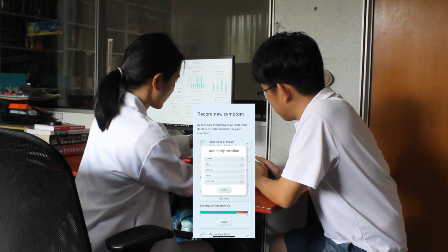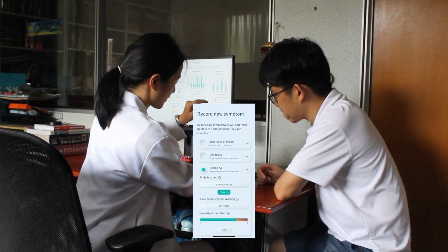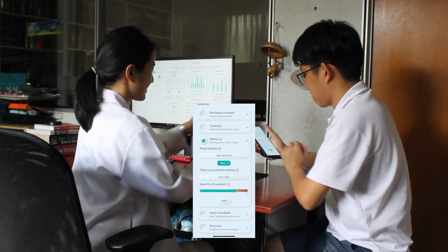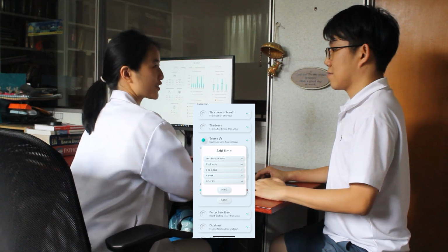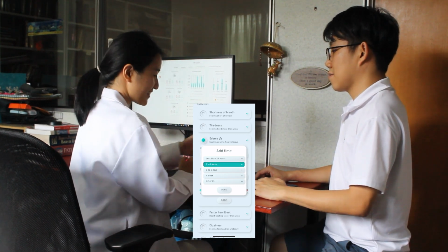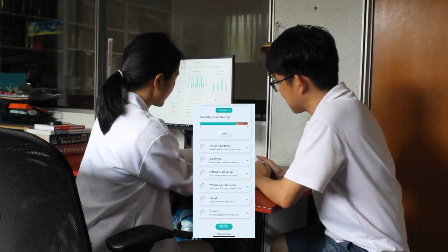After the patient has verified it, the intelligent agent will automatically prompt the patient to log in their vital signs. If a patient is out and does not have their medical devices to measure, it will remind again within every 12 hours as long as the patient records the vital signs within the 24 hours of experiencing the symptoms.